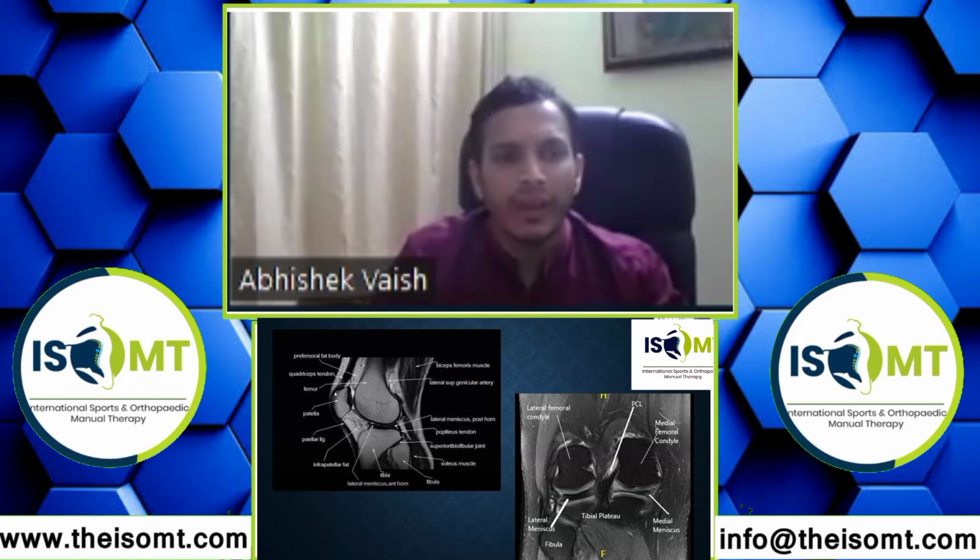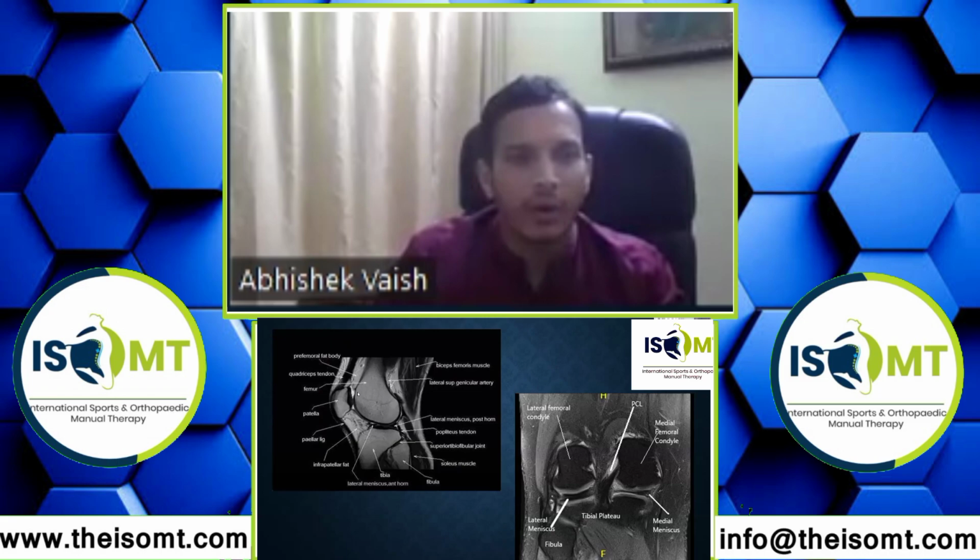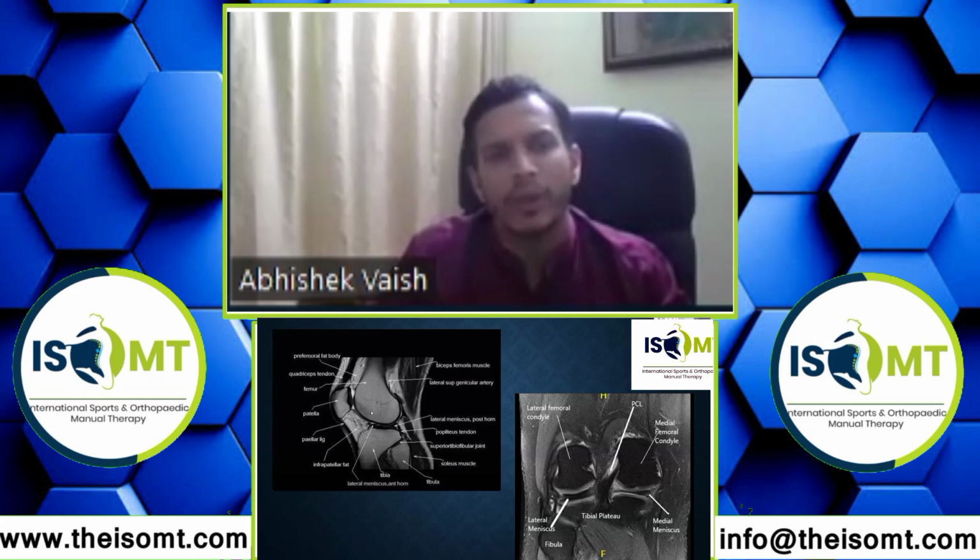In this film, if you see that this is the patella, that means you are looking at the anterior structures, and if you see the popliteal vessels, that means you are looking at the posterior structures. And again, you can see the fibula. So this is the posterolateral aspect of the knee which you are examining.